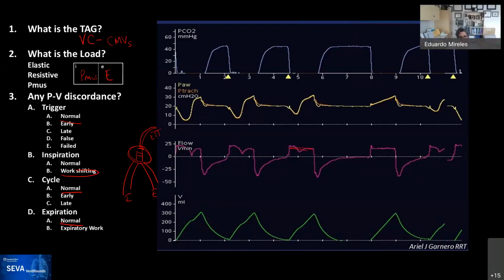And so the patient is generating so much negative pressure that, I presume, if you were at the bedside, you would see the tubing oscillate in size as the patient essentially is like a straw, sucking it and collapsing its walls. And so you see that change. And actually this serves essentially as a marker of the length of the breath, that you can see the breath goes from here to here.